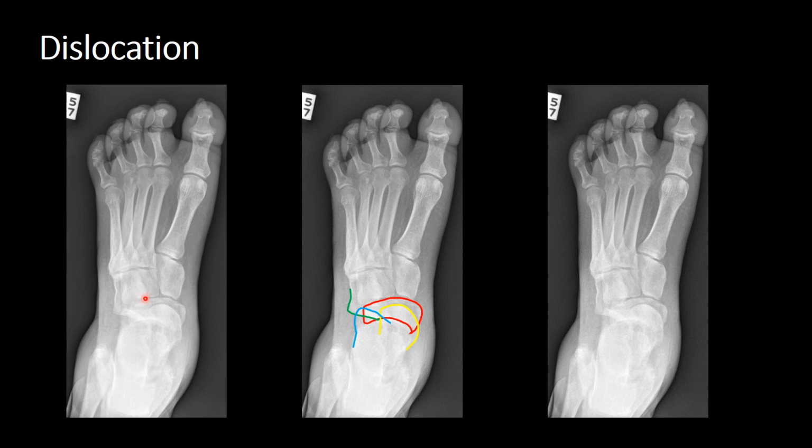If we look at our navicular coming around here, we can see that the talonavicular joint has been completely lost, and in fact the talus is now completely overlapping the navicular. If we look at the lateral margin of our cuboid, we can see that suddenly there's no articulation there of the calcaneum with the cuboid.